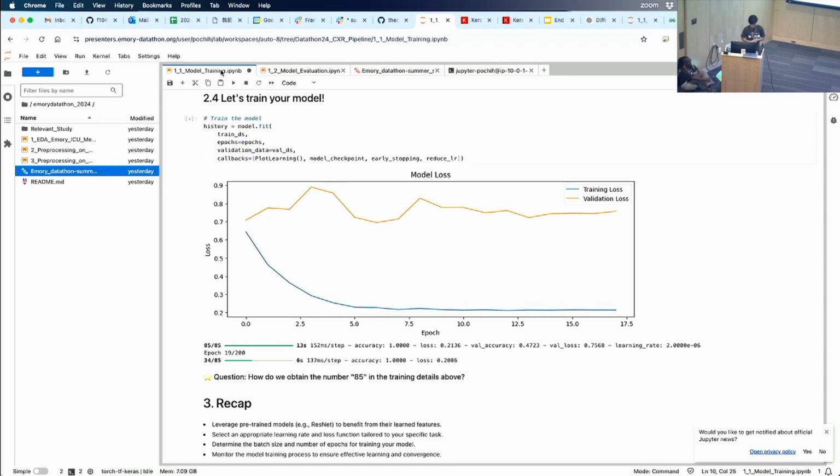So if in the logistics email I said you should sign up for PhysioNet because there are many data sets there, if you had retinal scans and you processed them well, all you would do is put them in this pipeline and it would go. Now you should probably give the right label, not just pneumothorax, no pneumothorax, and it does the same.